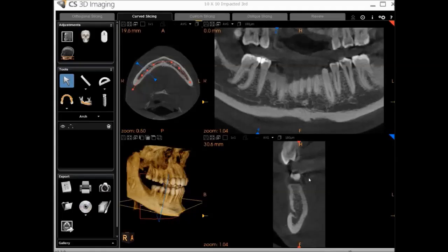To evaluate the anatomy for an extraction or an implant placement, you might need to locate the mandibular nerve. Using the Nerve Canal tool, you can trace a nerve canal on a reconstructed panoramic image. To make sure you trace the nerve canal accurately, select the best resolution possible in the Set Integration option.